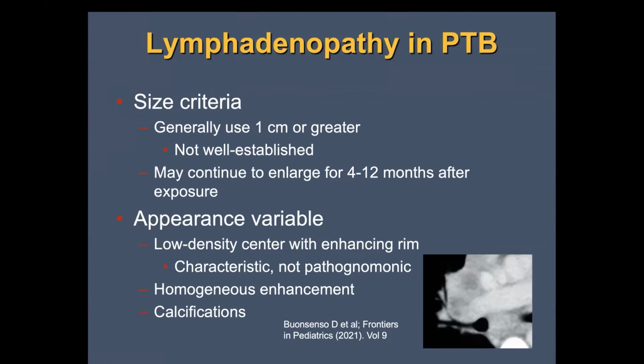Often you'll just see homogeneous enhancement of the nodes, and rarely in pediatric patients you'll see calcifications, although calcifications are much less common in the nodes in children than they are in adults.